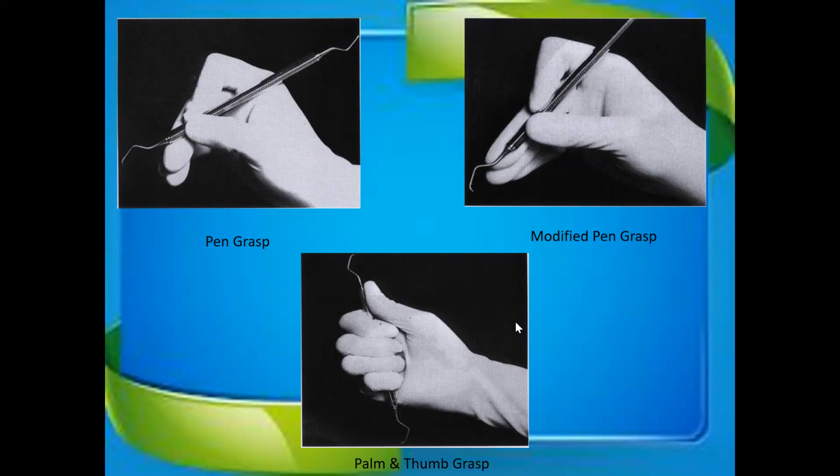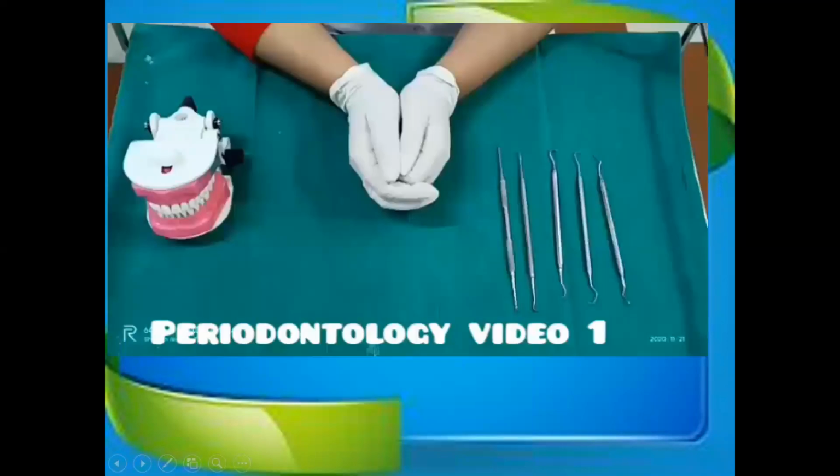So, this is a video that will be demonstrating various grasps.